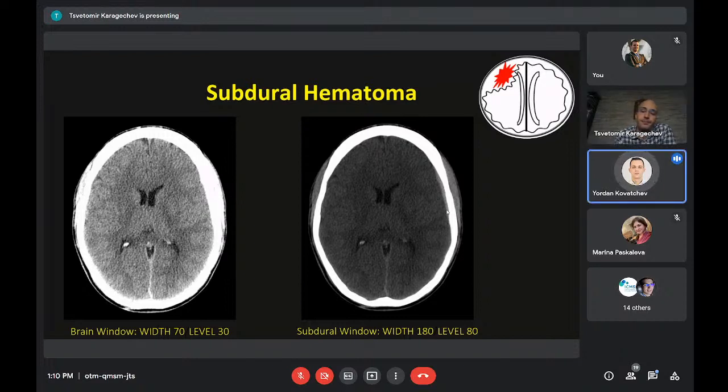And also you could focus even on the non-contrast CT on the sulci and see maybe if there is some slight displacement. You should see them clearly, how there is cerebrospinal fluid, and you can follow it to the skull, and there is some slight displacement there. There shouldn't be. There's always worrying. Sometimes this is a really hard case, but sometimes it's more evident. Although you don't see it as hyperdense, you see some displacement, and then this can be a sign as well. Even if you don't actually see the blood, it's just like an indirect sign. Yes, exactly. So a good point.